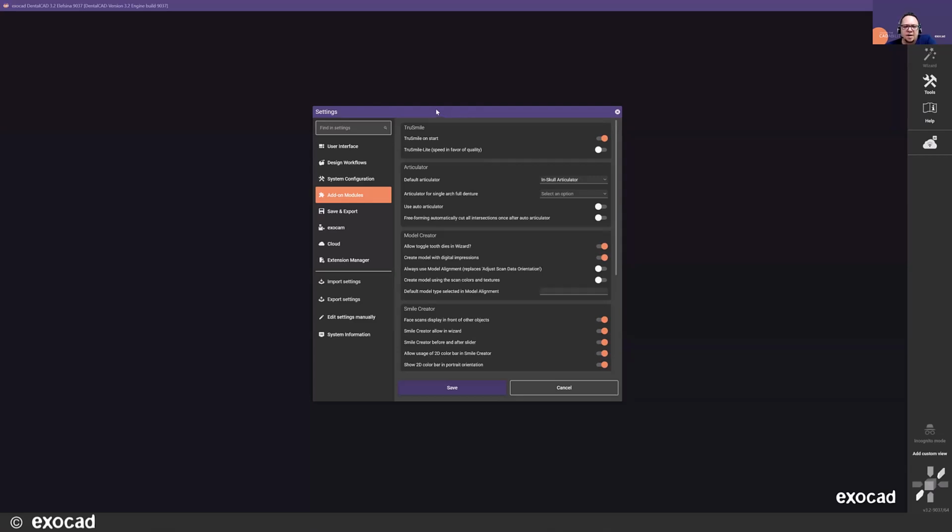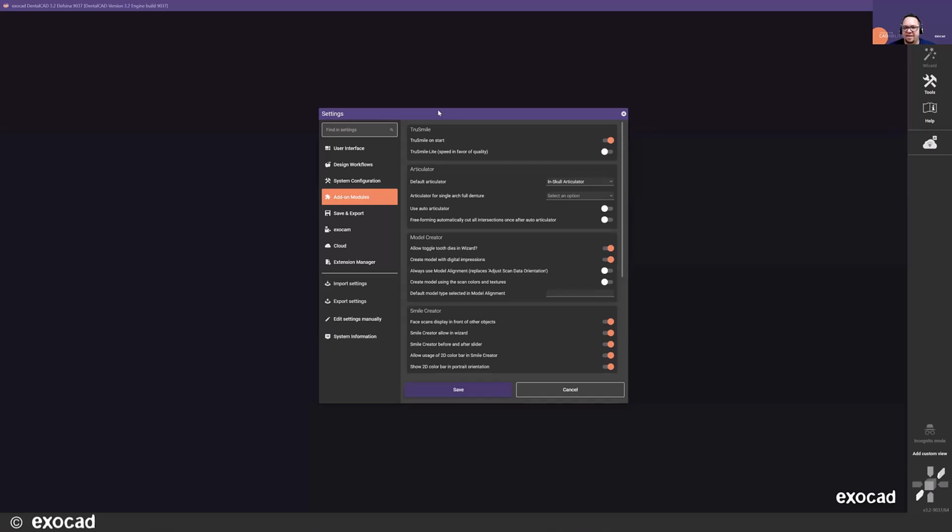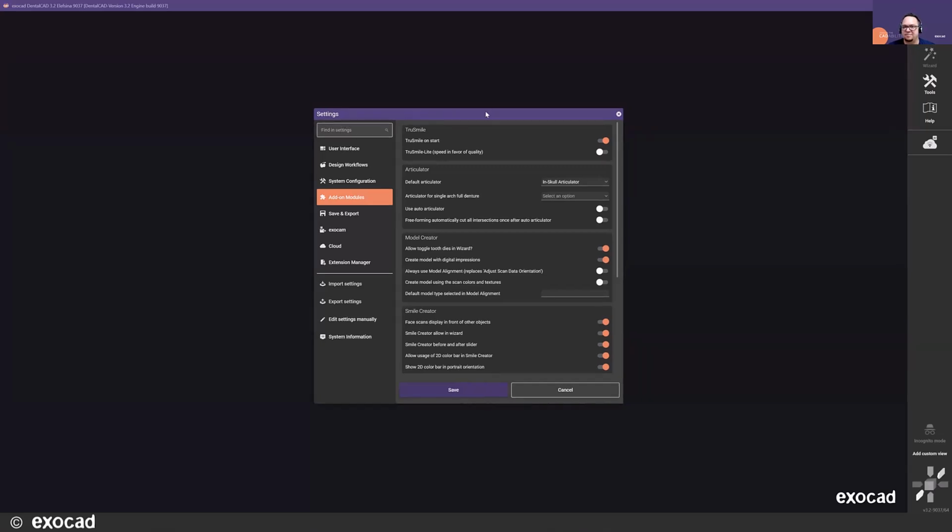And even the crown bottom step. So the crown bottom is what allows the internal fit of your restoration to be generated. Once you have your default settings put in place to get your default fit for cases, you can bypass that step. So a lot of time savings here. Just wanted to make everybody aware of that so they can fully utilize that.